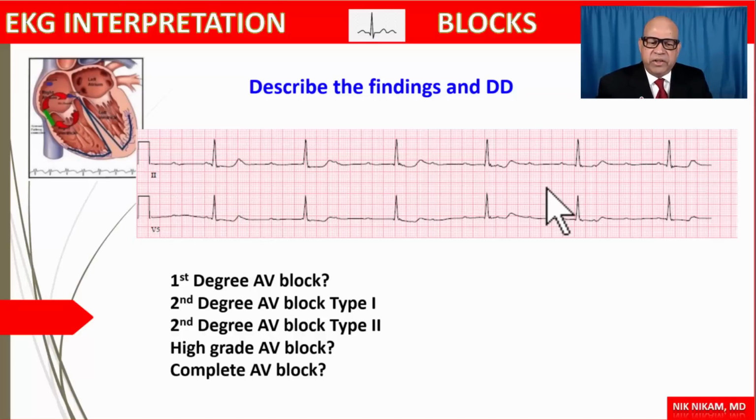So whenever we are dealing with conduction disturbances, we need to look at correctable abnormalities such as myocardial ischemia, presence of electrolyte abnormalities, or drug toxicity, either digitalis or even antiarrhythmic drugs that affect the AV node. So this is an example of a complete heart block with junctional escape rhythm. Let's move on to the next slide.